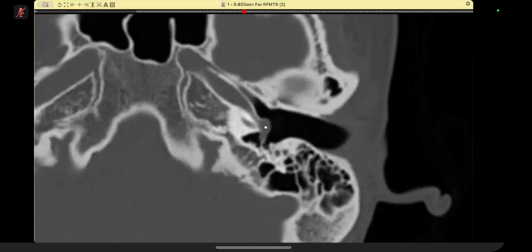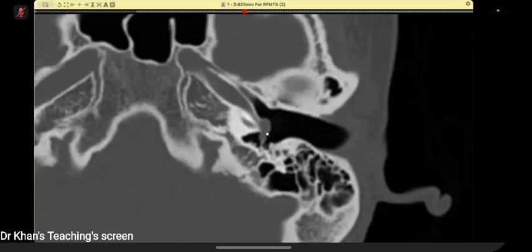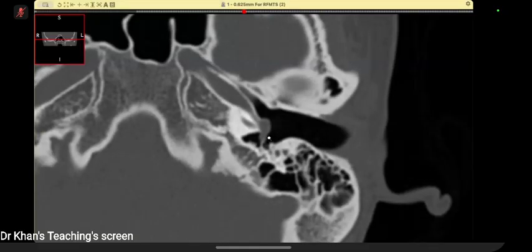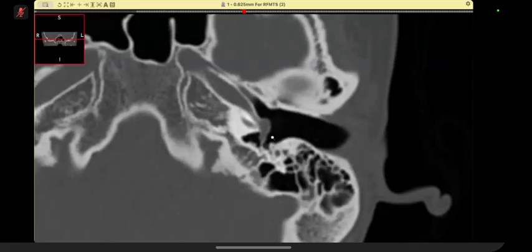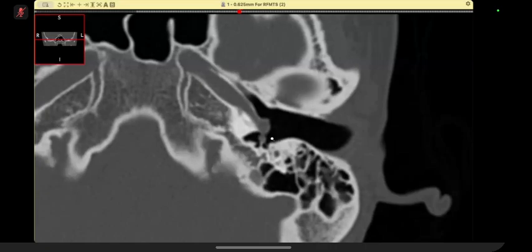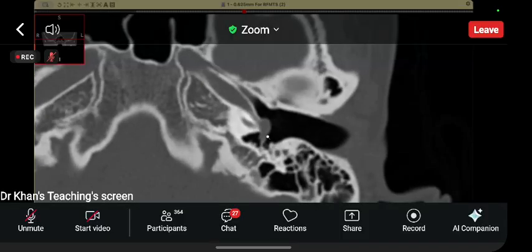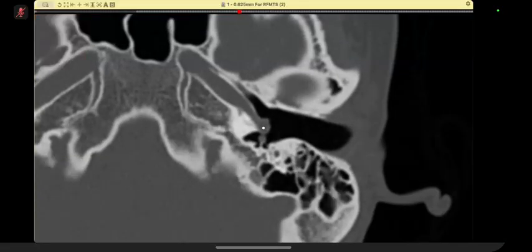And with that, there is a branch here which is known as the stapedial artery. This is the stapedius muscle lies here. We'll come back to this part of anatomy. Usually when a fetus is developing, there is an artery which has got this configuration, and after birth, it is all obliterated. In this case, there is a persistent stapedial artery, but more importantly, there is an aberrant internal carotid artery.